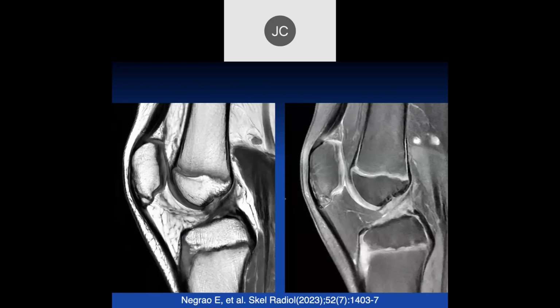Okay, so here, some irregularity with the anterior tibia, some edema there. Could be cartilage, because you have a growth cartilage there for the tibial tubercle. Obviously, there's a little avulsion injury here. So this patient's putting a lot of stress on that knee. This patient was a 9-year-old with stiffness and burning in the knee.